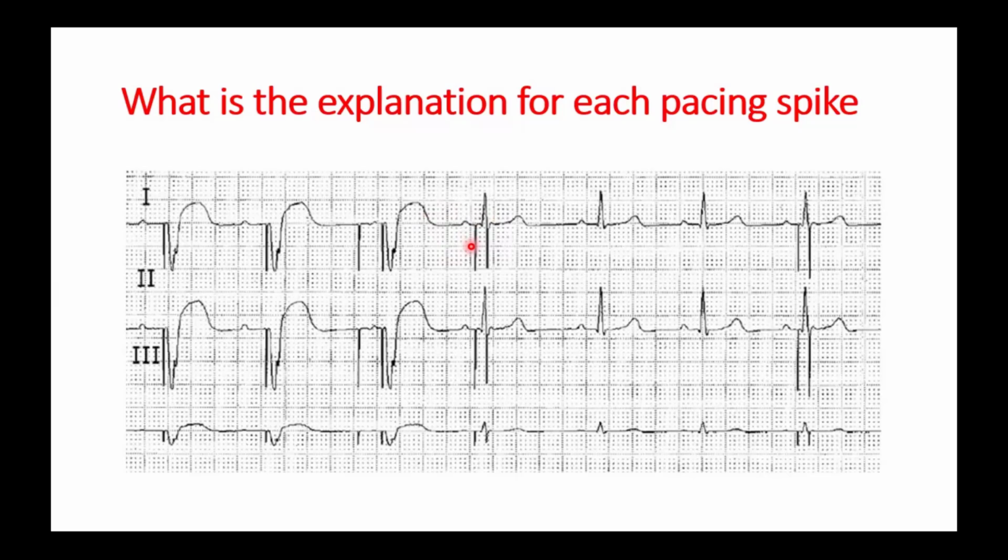So this is the difference in going down with the value of the sensitivity in order to make the atrial channel more sensitive. So you play with the unipolar and then with the bipolar. You measure the P wave sensitivity in unipolar and in bipolar mode, and then you decide what to do in order to avoid this.